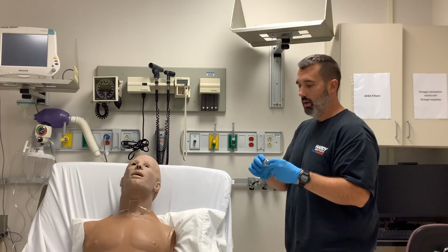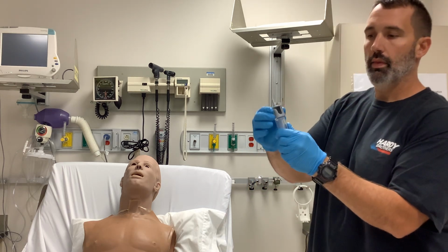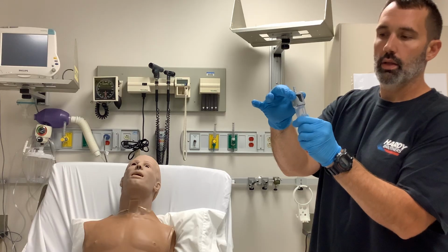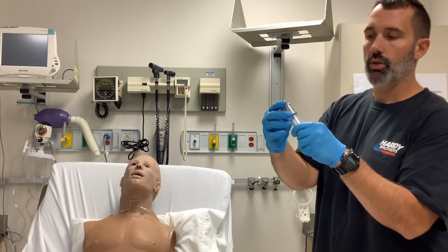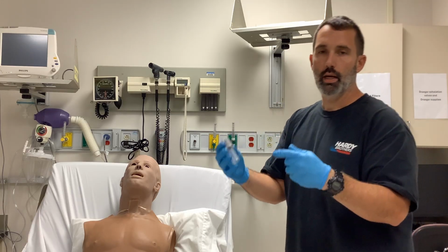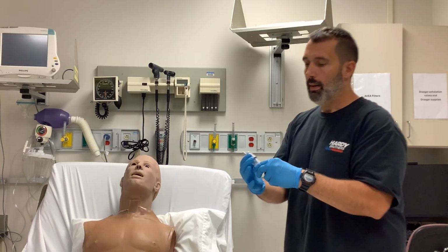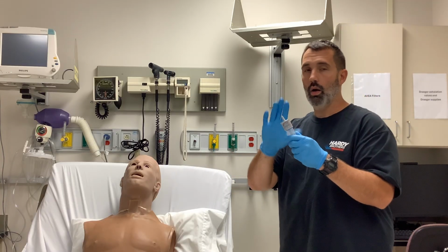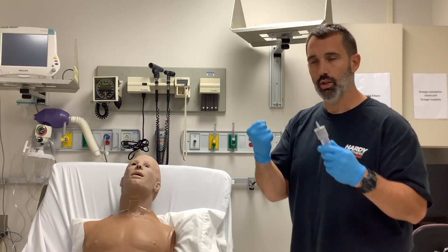So for instance, you'll notice that as I turn this dial, this window right here opens and closes. So obviously the higher the FiO2 you want, the FiO2 is going to be the delivered amount of oxygen. The FiO2 should be what the patient's actually going to inspire. And this is going to be where all those air to oxygen entrainment ratios and understanding that are going to come into play.